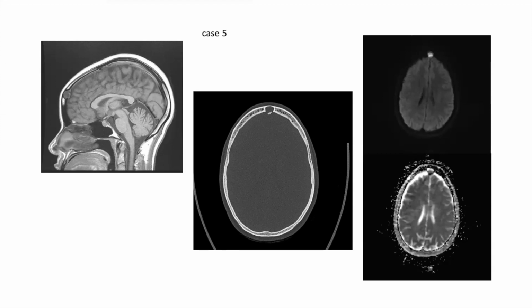Okay, very good. So, favored intradiploic epidermoid, and that is the correct answer. Why intradiploic epidermoid and not lymphoma? Lymphoma will have restricted diffusion frequently. Again, this is a dense cell packing lesion, just like medulloblastoma. And some meningiomas, they have restricted diffusion.